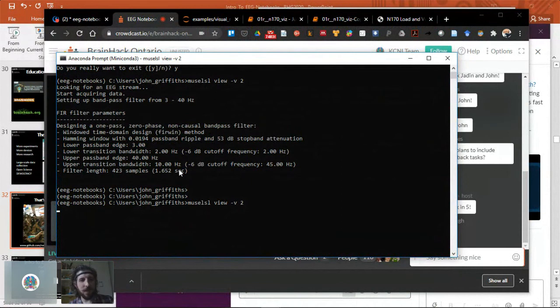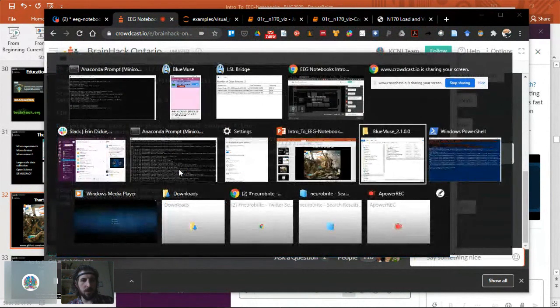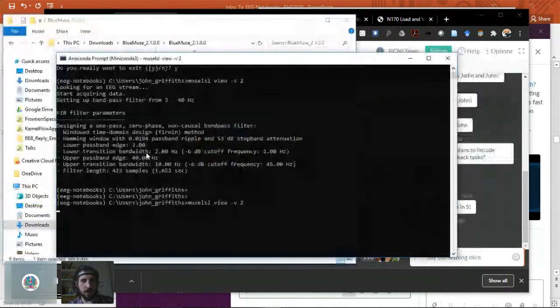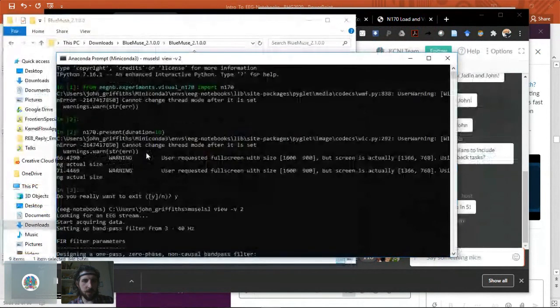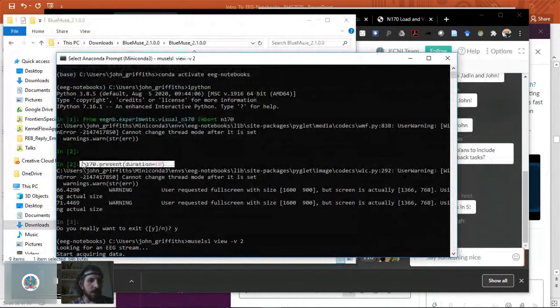Right? Now, in addition to doing the visualizer, I showed you in a little video running the experiment. The process for that, if we quickly look at the terminal I had, but I won't rerun it, was just import experiment and then run experiment. Now, doing that on its own just gives you the stimulus presentation, but it doesn't do the data collection. So it's a slightly more involved command to do the concurrent stimulus presentation and the data collection, which I'm not going to do right now because I want to focus on showing you something else.